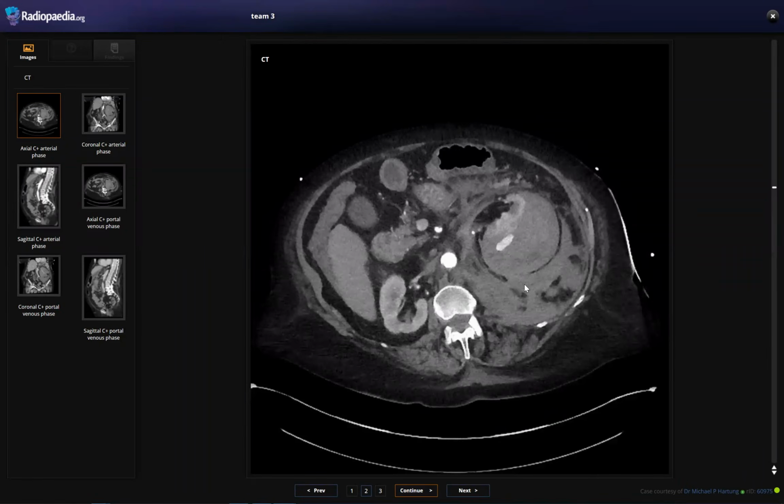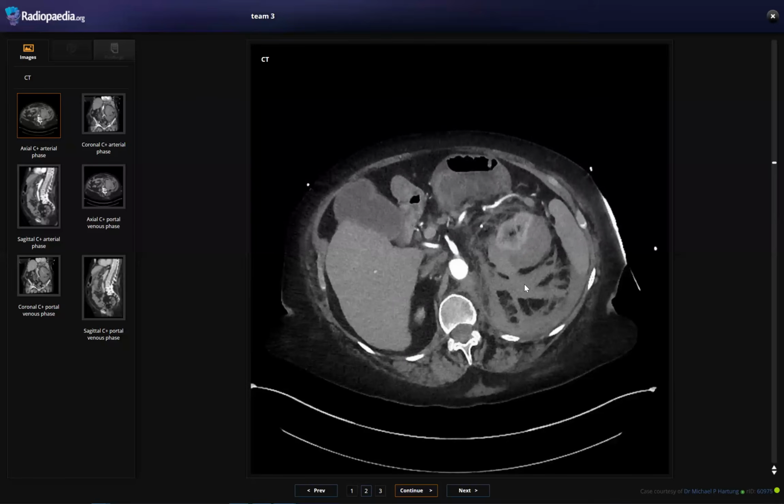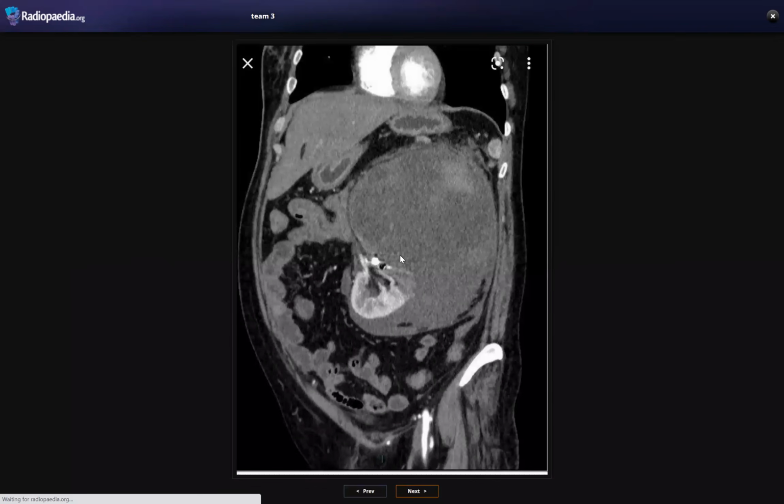What's the possible cause? Do you have any idea of the cause of the retroperitoneal hematoma here? If not seen in the image film, yes. Okay. It could be post-traumatic. It could be rupture of any mass, renal mass, could be from angiomyolipoma, or it could be from aneurysmal rupture, iatrogenic from a renal biopsy, or it could be drug related if the patient is taking any anticoagulants. And okay, patient goes to interventional radiology as you mentioned, but this is another different case.